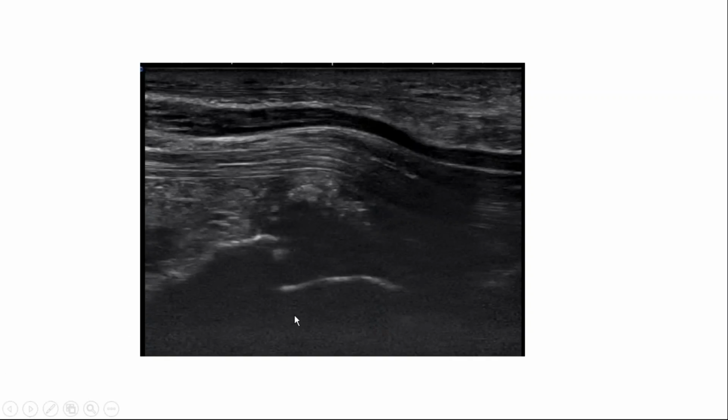Now, another one. This is a different patient, not the same patient. I don't have that image. This patient's median nerve was 0.12, big enough that you can say it's carpal tunnel. Again, this is a patient I got from a rheumatologist, so I make sure that I look for subtle changes, but this was not so subtle.